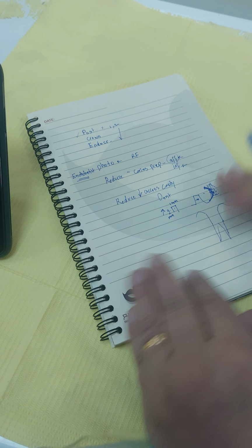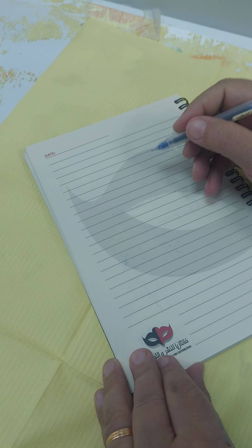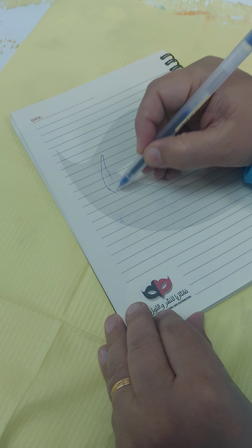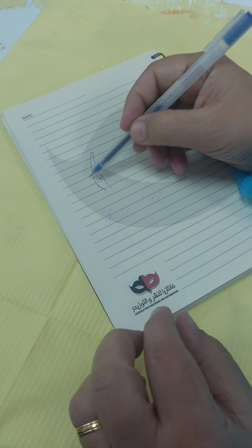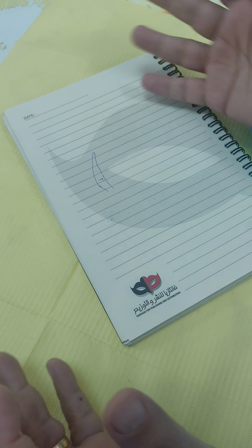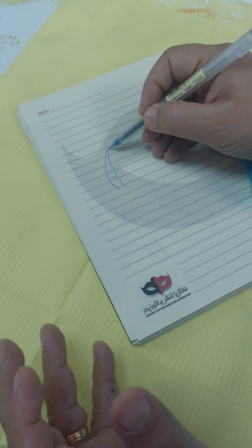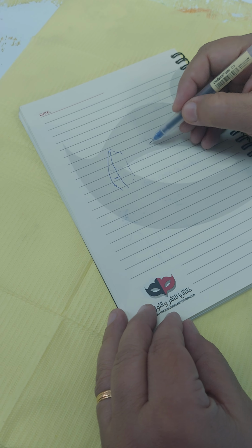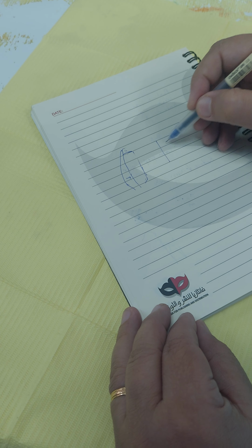What will all of this result in? And this is why I'm recording this video. All of this will result in me having enough. This is the enamel, let's say a shell of enamel, and we know the shell of enamel buccally is the thickest. And by the way, they're looking at this thickest area of enamel and thinking we have a lot of tooth structure. It's not the enamel. What we're looking for is the dentin beneath it. So this is the dentin. So they have an access cavity. So this is our dentin.